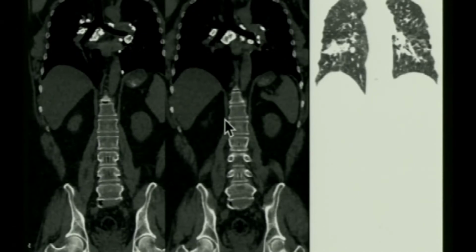So this is a 44-year-old man who presented with biopsy-proven sarcoid, but this was done as a part of a systemic workup, and this is the typical peripheral calcification that you see in the extensive mediastinal nodes. This is the lung window. This is the chest window, what we call the mediastinal window, and this is the lung window, where you can see there are nodules, there is fibrosis. So this becomes the stage 4 fibrotic stage of sarcoidosis.